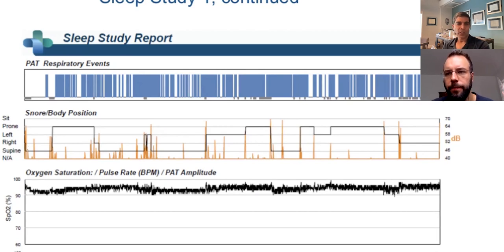And so you can see this person went from his back to stomach to right side to back to left, to back to left, to back to left. Well, you get the point, right? And so after a while, you get an idea of, okay, is this a lot? I think this is a little excessive. I think this patient's sleep is a bit kinetic. They do move a little bit more than maybe they should.